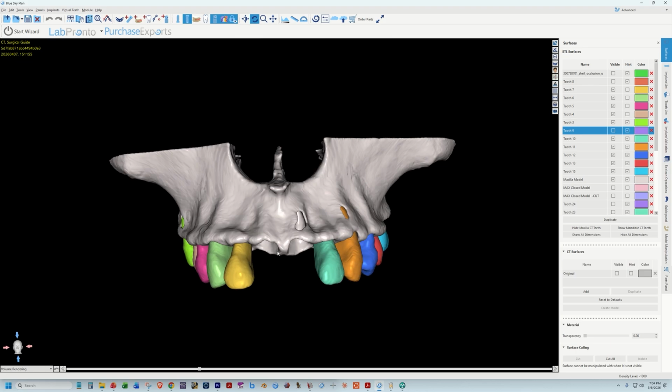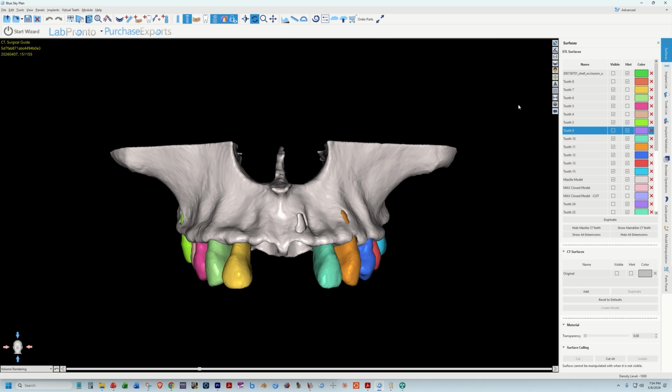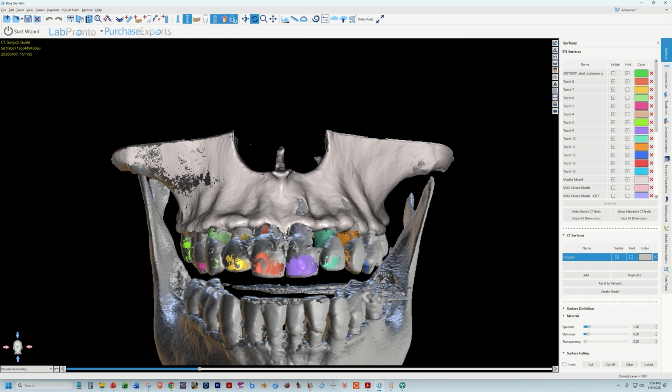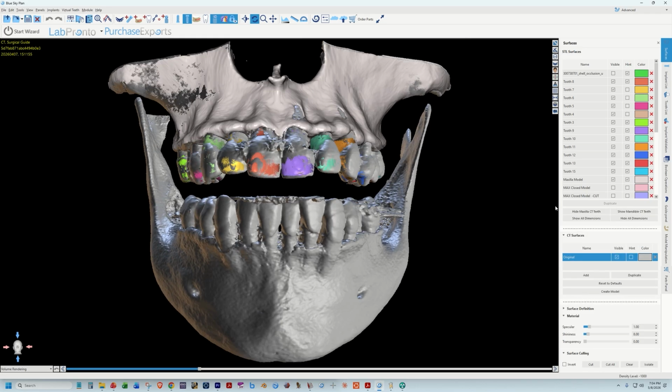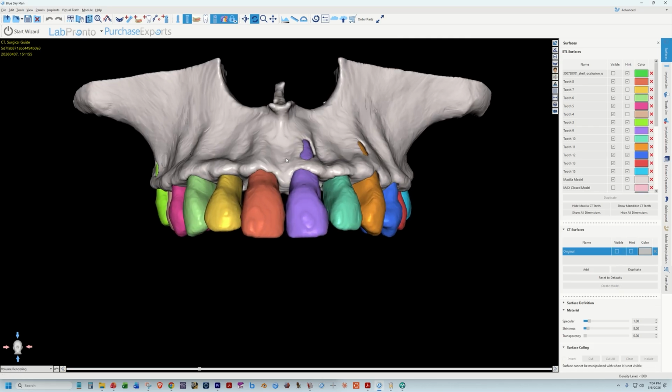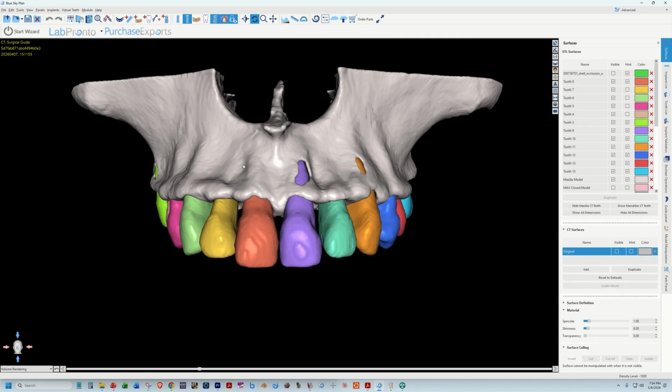But I don't find that very useful unless you're making a bone supported surgical guide, which does not apply to a case like this. All right, so anyway, that allows me to turn the cone beam off. Who wants to plan around this messy, noisy looking thing? If I can clean up my screen, make my work area a little bit neater, I like to plan from this instead.